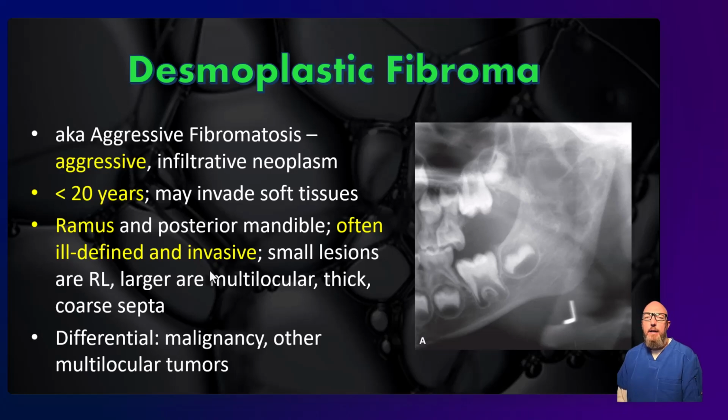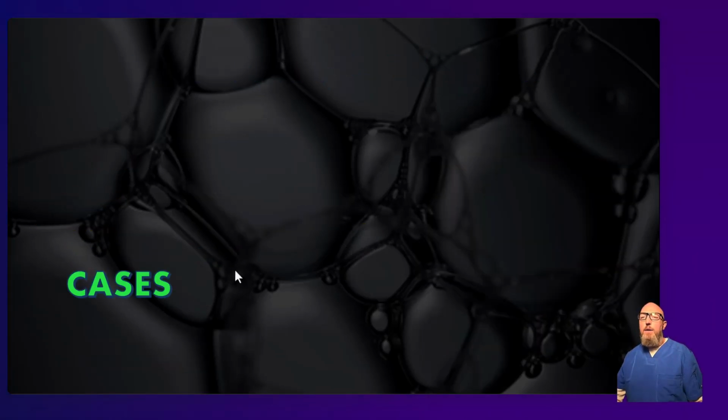Now if you're looking at all these previous lesions and think they all kind of blend together, well, don't worry too much. These last few lesions are really rare. You may never see them. Maybe you can lump some of these with other differentials. A lot of these look like they could be myxoma. And so if you have myxoma on your differential and it ends up being one of these, I would say you're mostly correct, right? You're in the right ballpark at least, and that's where you need to be. So now let me test you. Let's go through some cases and see how we do.